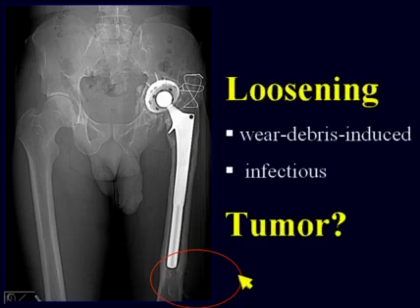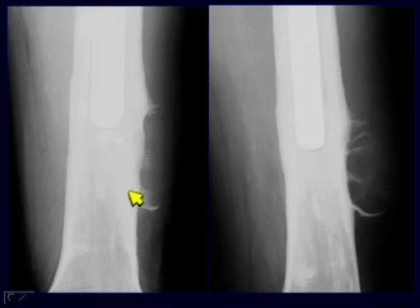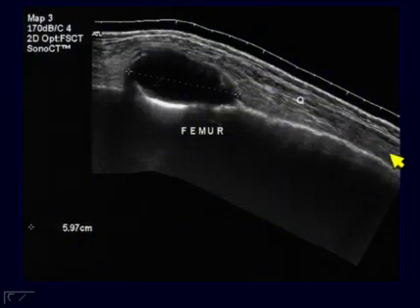So what are we looking at here? Are we looking at a failed prosthesis? Are we looking at secondary tumefactive changes in this individual, like sarcoma, or is it simply loosening? So we begin by looking first at the baseline radiographs. Cone down views show you that at the very end of the tip of the prosthesis you have this cauliflower, frightening appearance, spiculated lesion. And that's what we're going to address. Therefore, it's unnecessary to go to the acetabular portion.